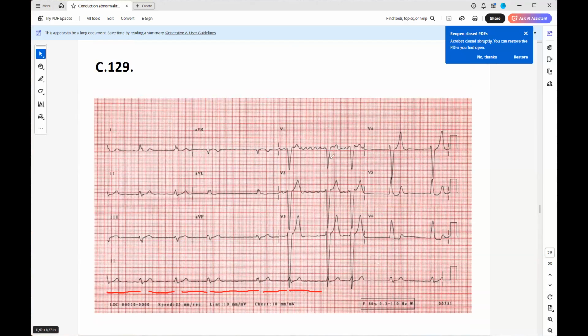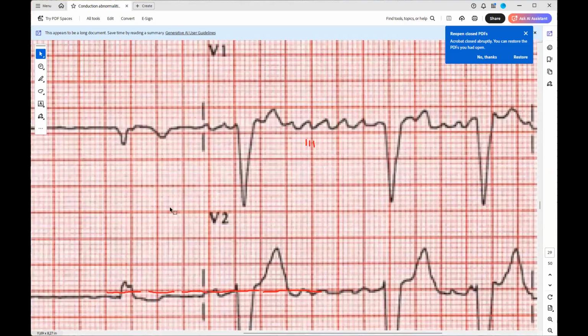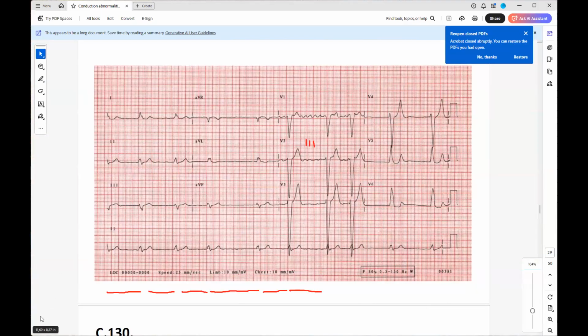It was hard to see, but P wave, I thought there. Almost, okay, look at lead number 2. There's no P wave. It's not a nice round-shaped P wave. Good. If you look at V1, you do see a very fast wave, look at the rate. It's very fast. It's more than 350. What does it mean? What does it mean when the atrium has a rate of between 350 and 600?